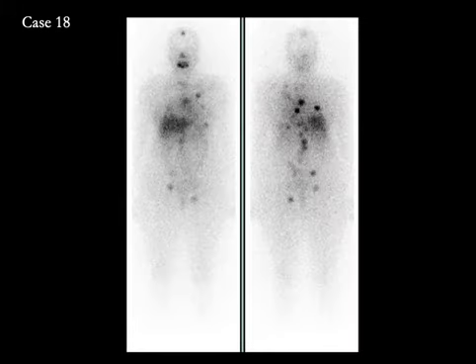Case number 18 shows an I-131 whole body scan performed as a part of a post-therapy scan. They were known to have lung and bone metastases from differentiated thyroid cancer. They received 200 millicuries of I-131 for treatment, and 5 days later we did a post-therapy scan, which shows these foci, better seen posteriorly in the spine and the pelvis, and some foci in the chest which are consistent with lung metastases. There is increased uptake in the liver, and that is because these metastases have taken up I-131. They have metabolized I-131 and made thyroid hormone, which is radioactive, and that thyroid hormone is next metabolized by the liver, because of which we see uptake in the liver.